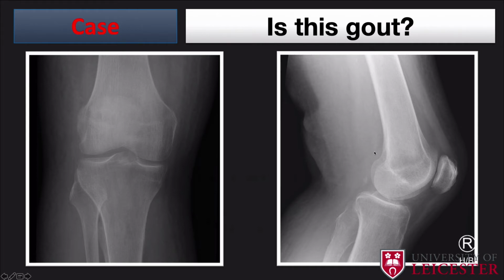And you have ligaments. So you have your quadriceps tendon, which you can actually see quite well on this radiograph. Your patella tendon here, which attaches from the inferior patella to the tibial tuberosity. And sometimes you can get a small ossicle here. This is what we call a fabella. So within the lateral head of gastrocnemius muscle, you can get this additional bit of bone. So don't always overcall that.